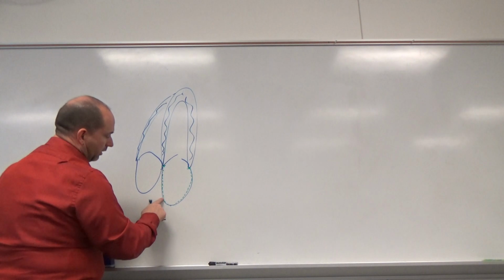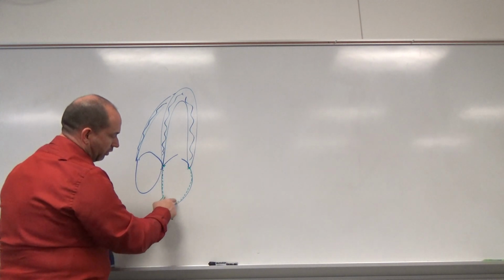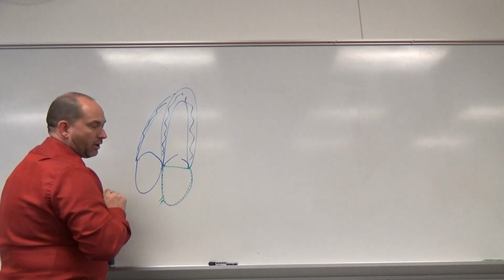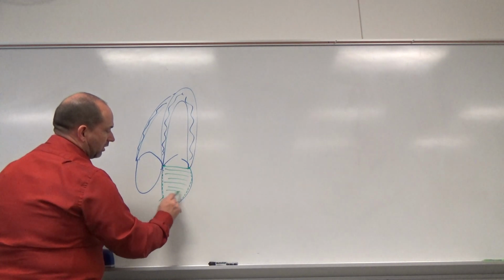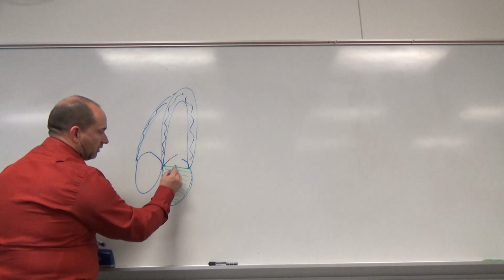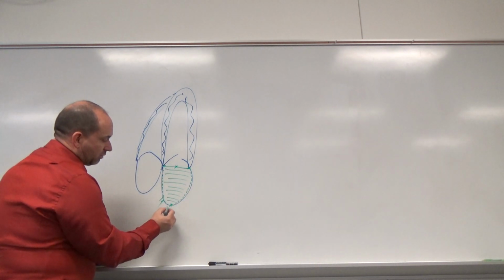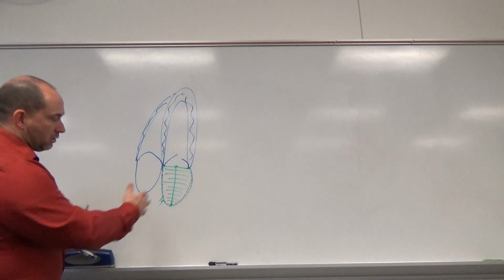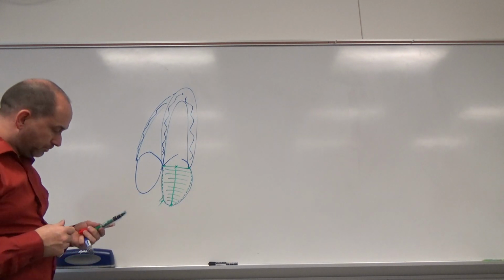If I've got a right upper pulmonary vein coming off of there, I ignore it. We go around it to the other annulus. We lock it. It draws the line across the annular plane. It creates those mini discs that we talked about before, and creates the volume, and it measures the center of that annular plane to the maximum distance back in the atria. And that could be a little bit off angle on either side, but that's how you do a volume.